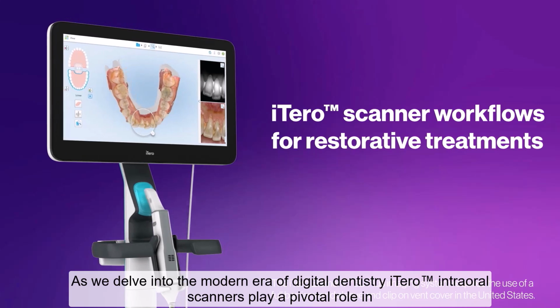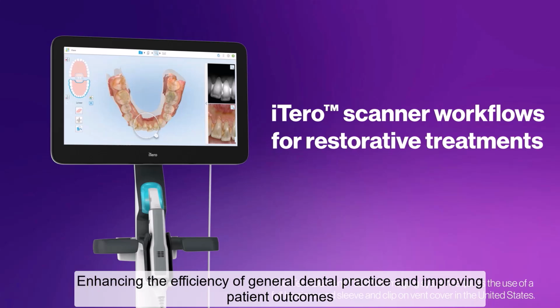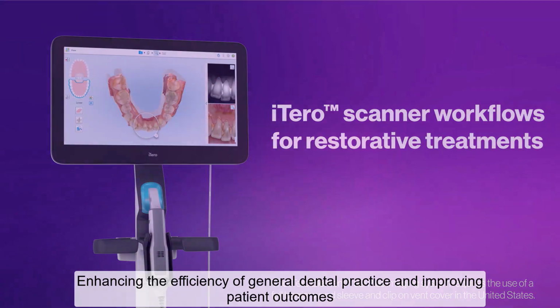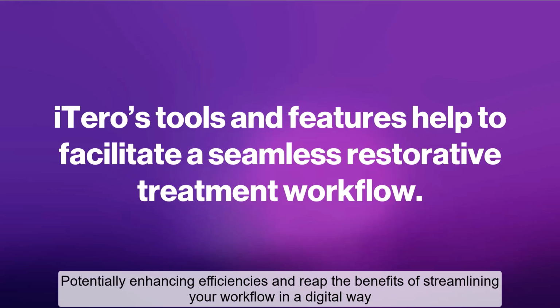As we delve into the modern era of digital dentistry, iTero intraoral scanners play a pivotal role in enhancing the efficiency of general dental practice and improving patient outcomes. Let's walk you through how iTero's tools and features help to facilitate a seamless restorative treatment workflow, potentially enhancing efficiencies and reap the benefits of streamlining your workflow in a digital way.